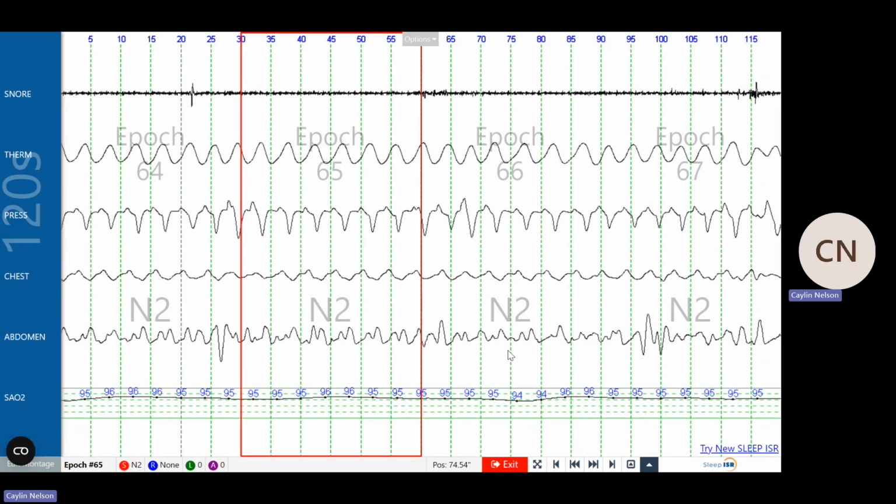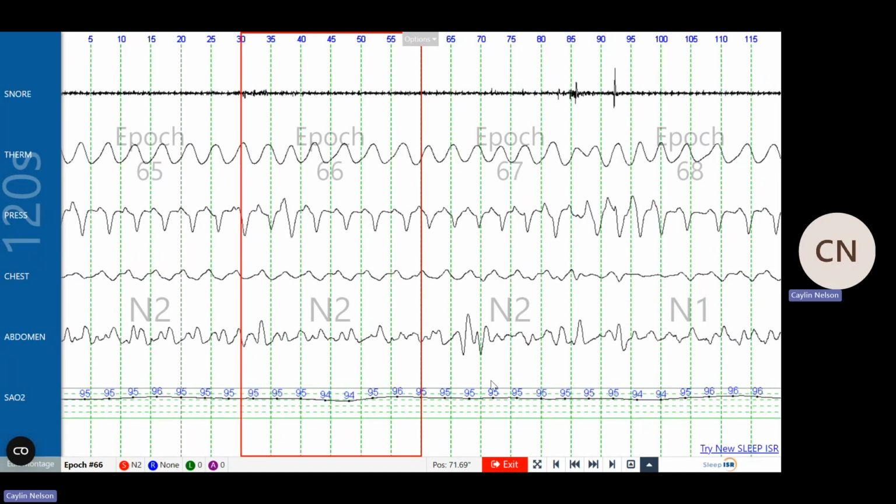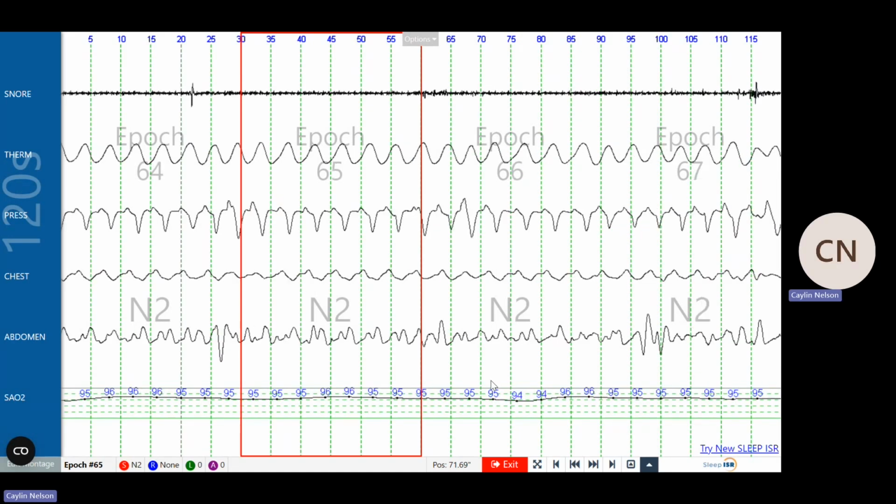So just comparing the two together, because obviously when the patient's breathing normally, their chest and abdomen will likely be going in the same phase. Sometimes if it's out of phase, you may just have to invert your channel, specifically when it comes to the polarity of the channel. In different programs, you can adjust the channel and the specific polarity of waveforms. So that's the same when it comes to airflow channels. Your EKG, if that's ever randomly upside down, that is when you would invert your polarity to make it easier to observe.